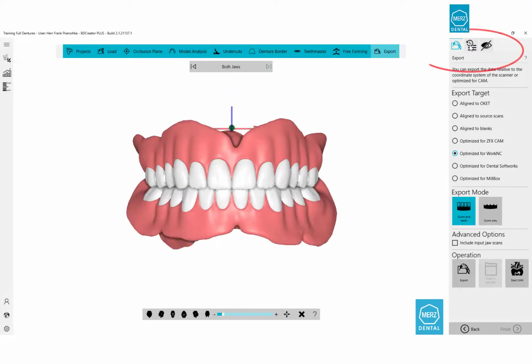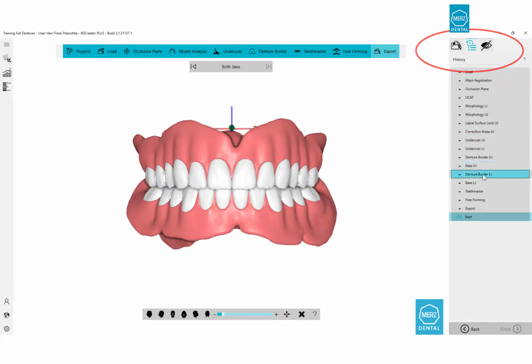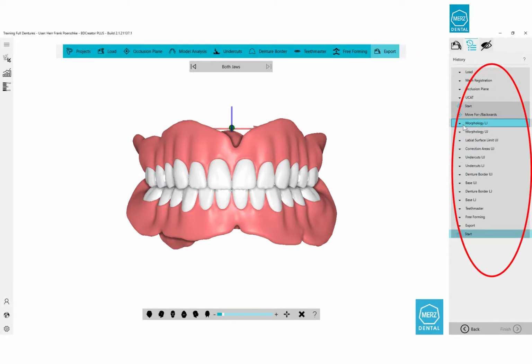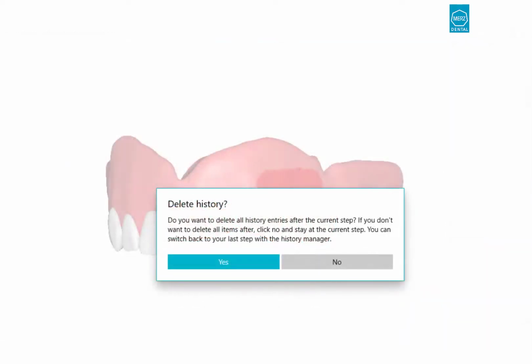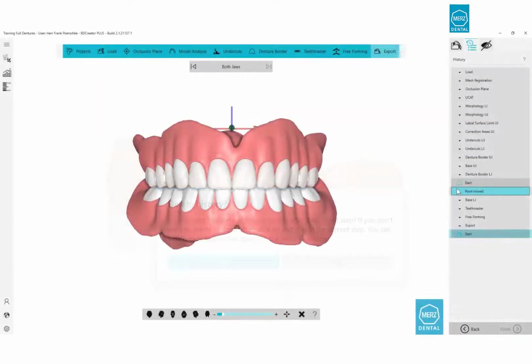The middle button in the right work area helps to call up the various work steps directly. This could be necessary in order to view or change individual work steps. Careful! If changes are made in one step, a warning about the change in the data situation appears. If this is confirmed, all of the following steps must be repeated. Therefore, a change must be carefully considered.